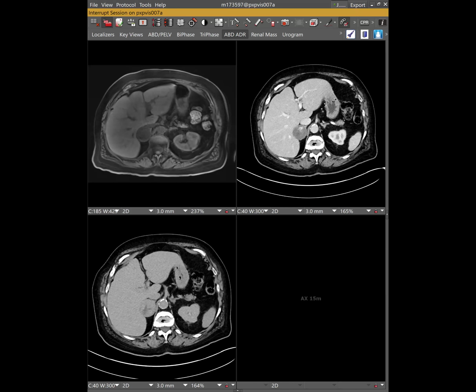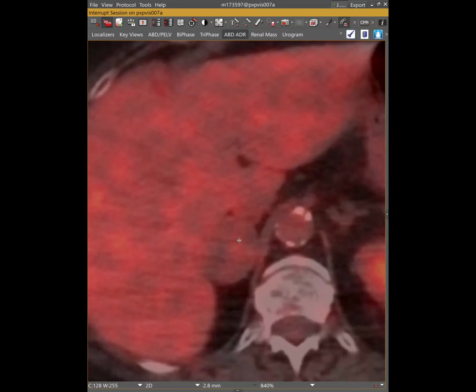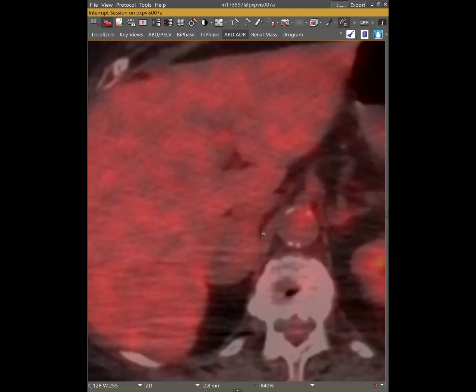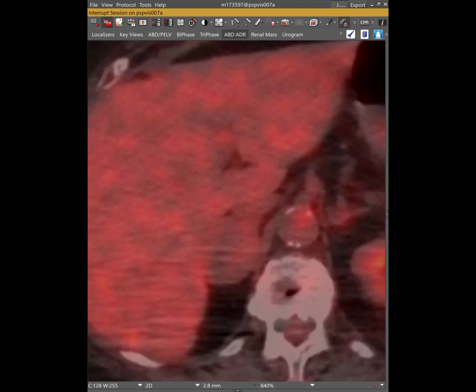If I let me put it back on that screen. If you compare it to the aorta, it's kind of similar heterogeneity. You see the same level of heterogeneity in the blood pool in the aorta. So I think it's just FDG within the blood. It's bleeding into the hematoma. So then that's why we see it fill in on the venous. Like it's just slow interstitial blood. Yeah.